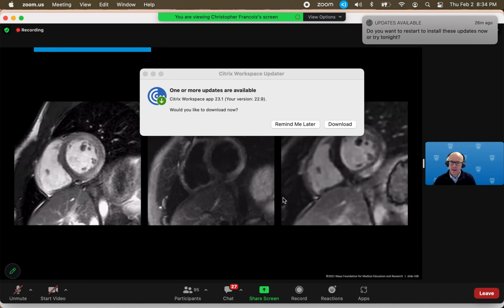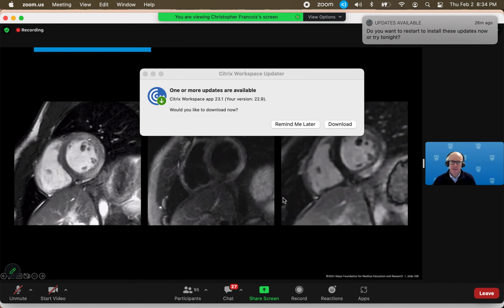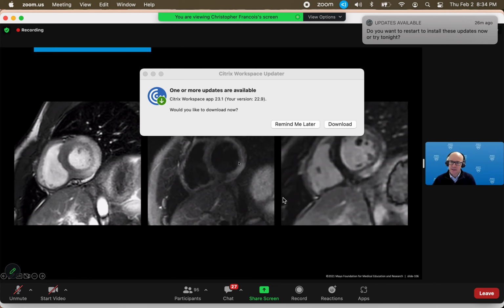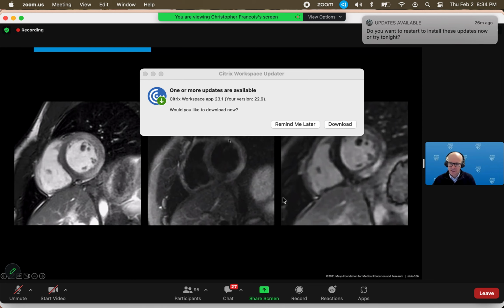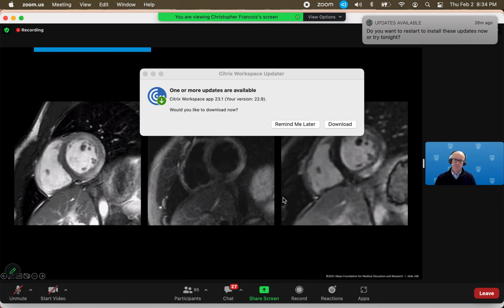This is another patient with acute myocarditis. In this case, you can see the bright signal intensity from the myocardial edema on the cine images. This T2 weighted image in the middle shows diffuse increased signal intensity in the lateral and inferior walls. That's myocardial edema from acute myocarditis. And then we see mid-myocardial or mesocardial and subepicardial enhancement on the late gadolinium enhancement images.